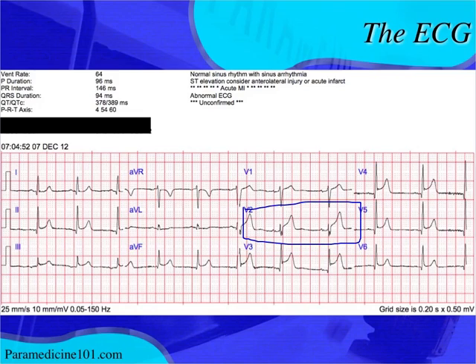Also, the R wave in lead V2 is a little bit tall for that entire QRS complex being small. That's a pretty big R wave. That's not typically normal. We also see the ST elevation in V4, a little bit in V5, not a whole lot in V6.